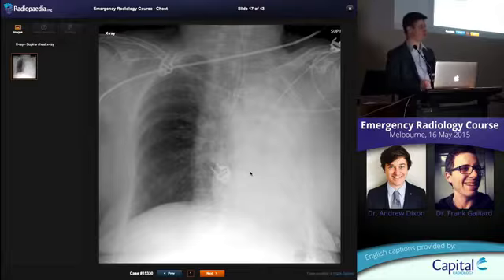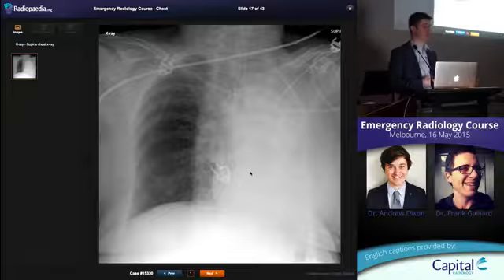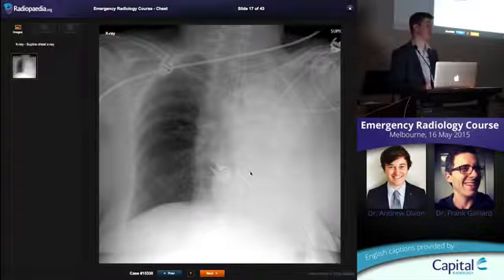If it was a big pleural effusion that's in this chest, pleural effusions have positive mass effect. They're going to push the mediastinum and the trachea away to the other side. Okay, big difference between the two. One problem is that they can coexist. You can have some effusion and some collapse. Usually if you've got a massive effusion, the lung is always completely collapsed, all right?